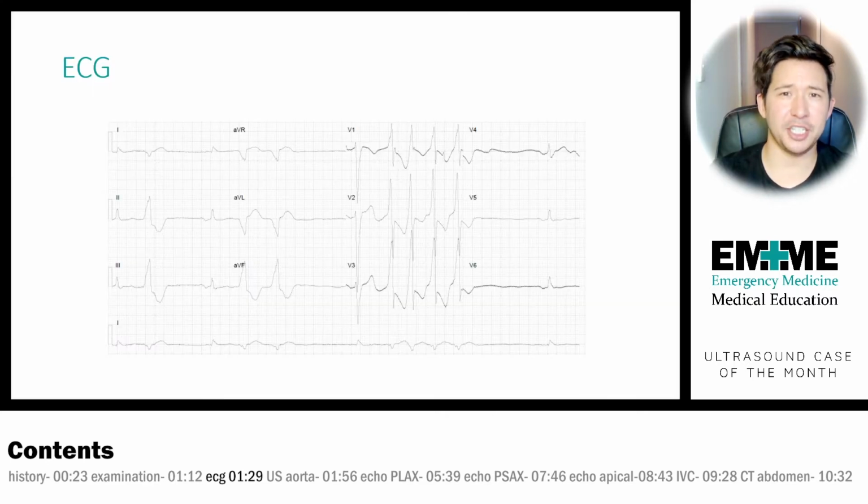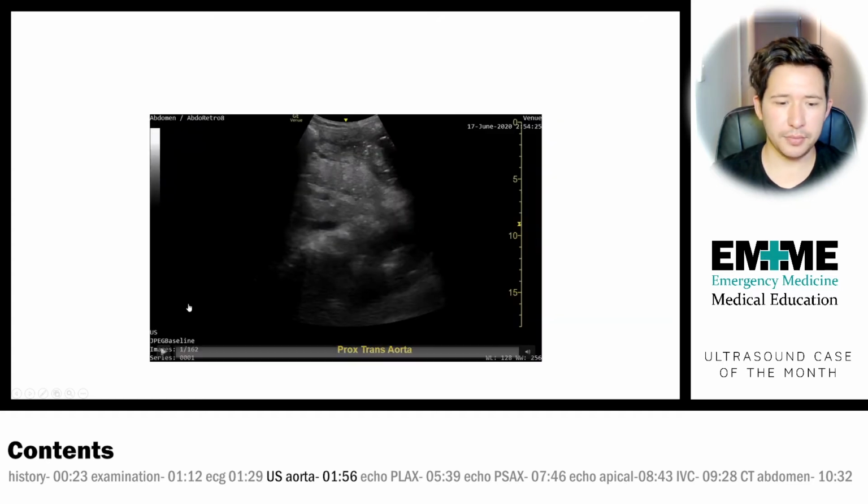He has an ECG which actually captures a short run of non-sustained ventricular tachycardia, and you can see these broad complexes in the middle of the trace, which is the ventricular tachycardia, and then there's a few narrow complexes on either side that are a different rhythm from the heart. So he's doing something slightly unusual with the electrical activity of his heart, but he otherwise looks pretty well.